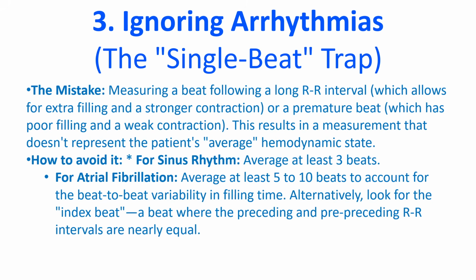3. Ignoring arrhythmias, the single beat trap. Calculating LVEF based on a single cardiac cycle is risky, especially in patients with atrial fibrillation or frequent ectopics. The mistake: measuring a beat following a long RR interval, which allows for extra filling and a stronger contraction, or a premature beat which has poor filling and a weak contraction. This results in a measurement that doesn't represent the patient's average hemodynamic state.